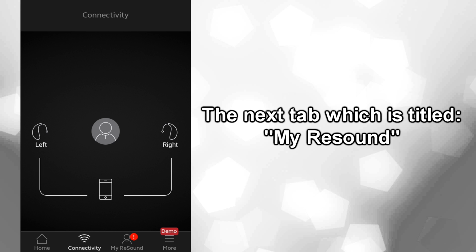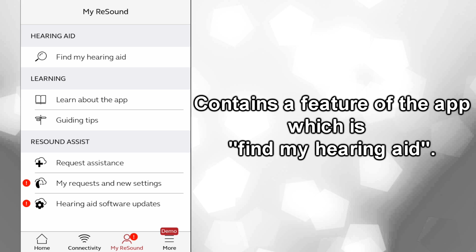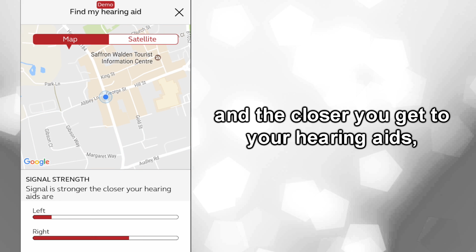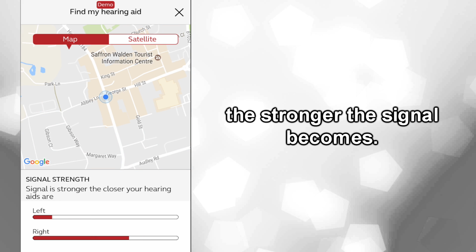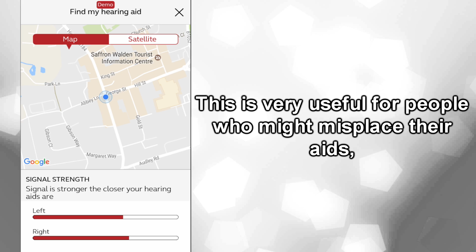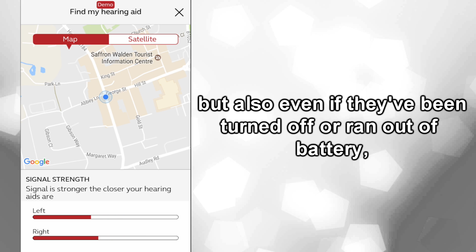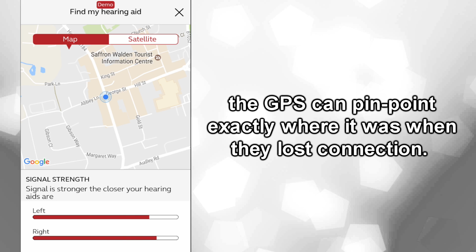The next tab, which is titled My Resound, contains a feature of the app which is Find My Hearing Aid. As the name suggests, the option opens up a map, and the closer you get to your hearing aids, the stronger the signal becomes. This is very useful for people who might misplace their aids, as the app can track where your hearing aids are, but also, even if they've been turned off or ran out of battery, the GPS can pinpoint exactly where it was when they lost connection.